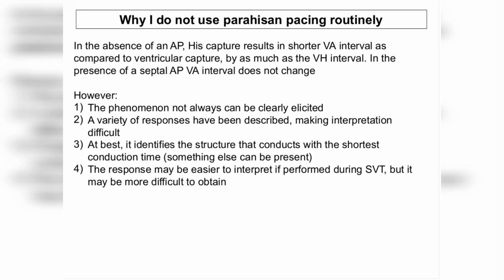Yeah, absolutely. A comment I could make about that is that this is a dynamic maneuver. You always have to stimulate through the distal pair, and in case you wonder whether you are capturing the atrium, you only have to push the catheter forward and test it. In these examples you only have a fixed frame, but in the EP lab you can really make the difference by moving the catheter, and you can check it easily. Good. Okay.